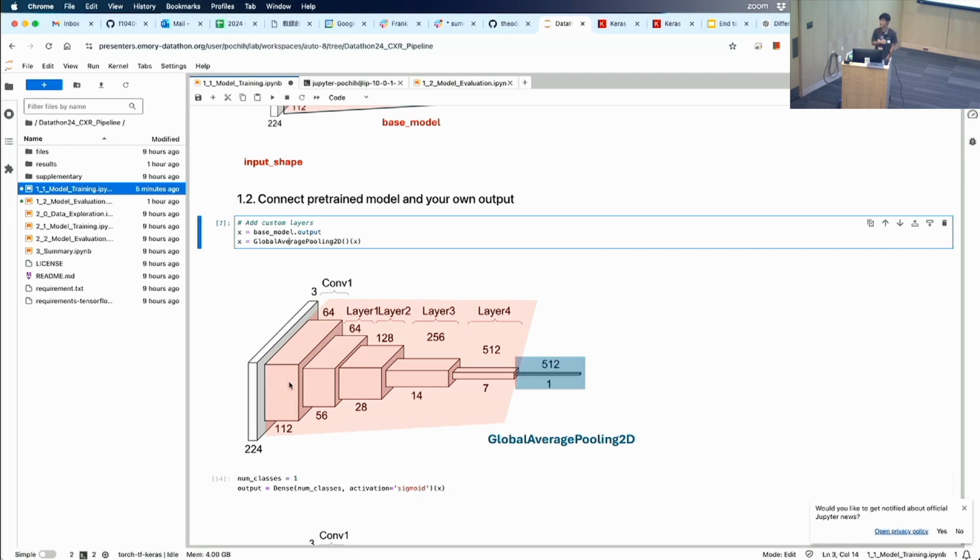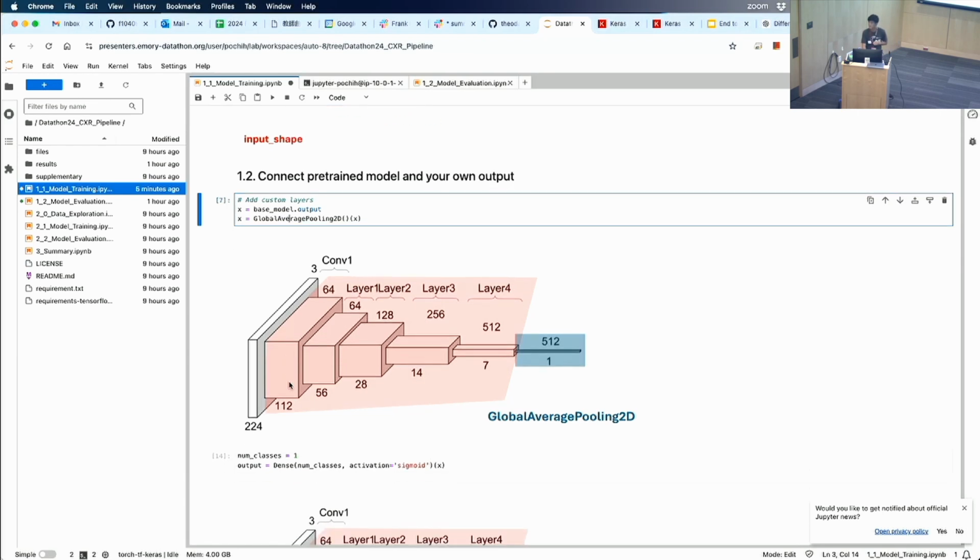What's on the GitHub is pretty much what needs to be done. It just takes time. What I cannot do right now is find my GPU, although I'm using the one I had yesterday, so I need to go back and figure that out. But as that process is going, we just want to re-explain some of these concepts so that it makes sense, instead of just running through code.